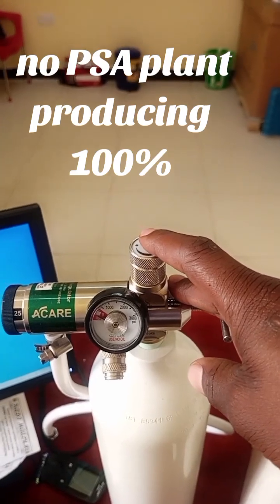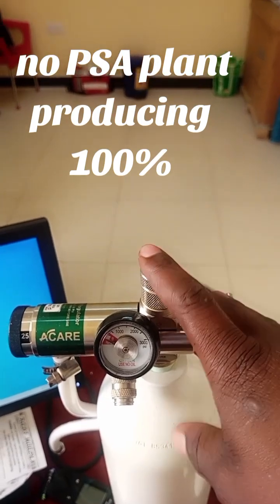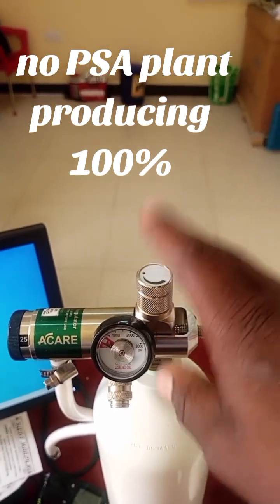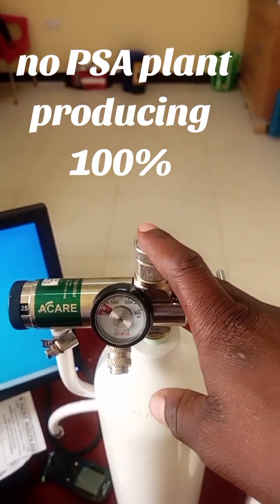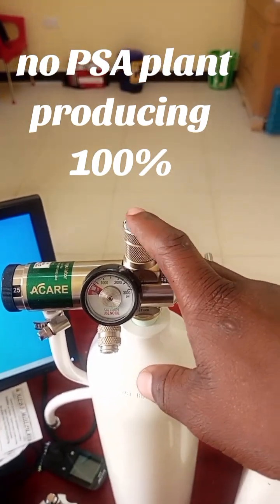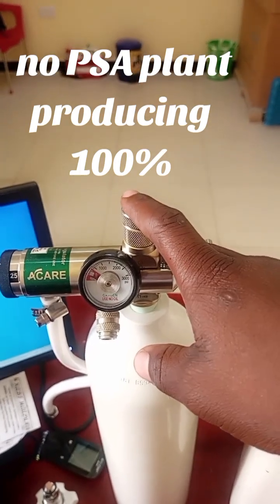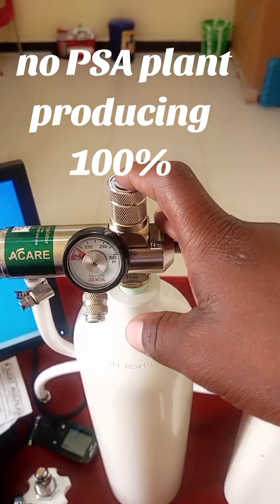So what if this is used for the patient? It needs the user to have a backup gas cylinder so that when the gas cuts off, there can be a replacement to ensure there is a constant oxygen supply to the patient with no cutoff.